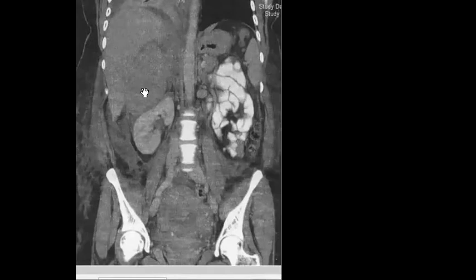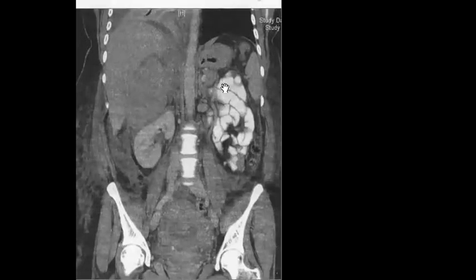Yes, secondary to low platelets and DIC, disseminated intravascular coagulation. The retroperitoneal region here is the site of the suprarenal gland. What happened in this region? Adrenal hemorrhage. Yes, exactly. So this is expected to happen for this patient.